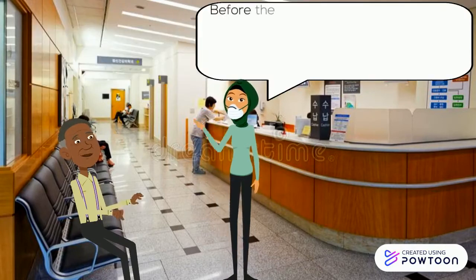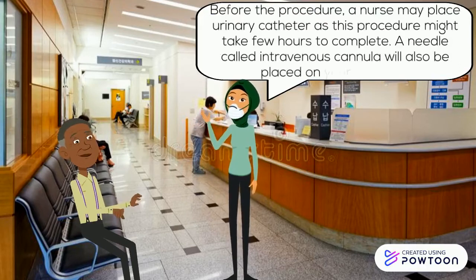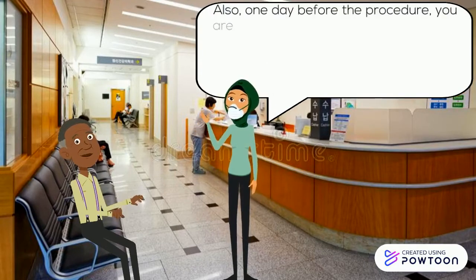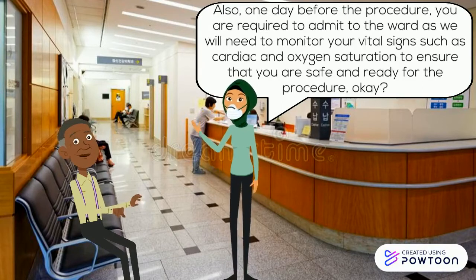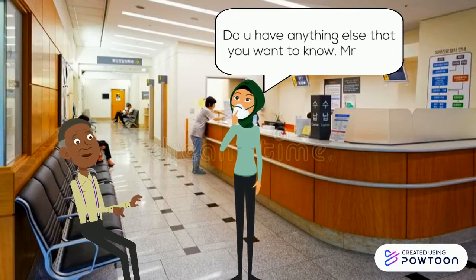All right. Before the procedure, a nurse may place a urinary catheter as this procedure might take a few hours to complete. A needle called an intravenous cannula will also be placed on your arm first. Also, 1 day before the procedure, you are required to be admitted to the ward as we will need to monitor your vital signs such as cardiac and oxygen saturation to ensure that you are safe and ready for the procedure, okay? Noted.